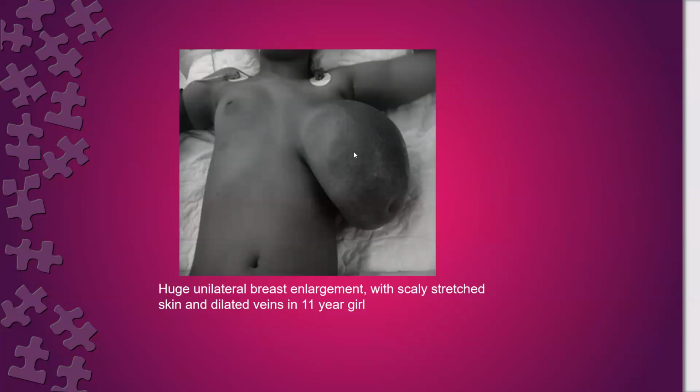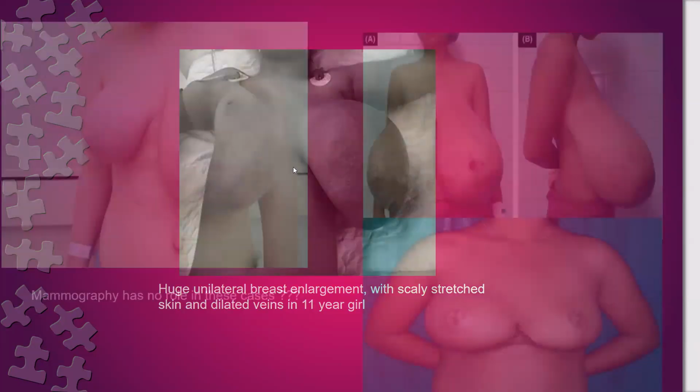When ultrasound demonstrates excessive glandular tissue, excessive glandular parenchyma, that is unilateral. So this could be macromastia. It is macromastia, but with engorgement of the veins due to rapid excessive breast growth. It can be unilateral. Rare, but it can be unilateral.